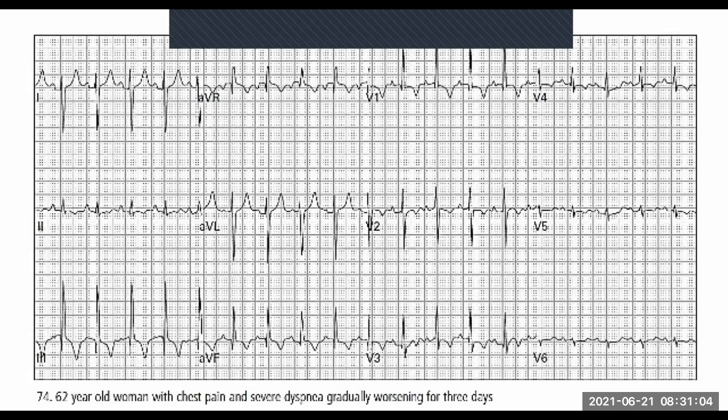You guys should already be getting close to what the diagnosis should be. We've seen this before, right? But anyway, we've got these inverted T waves all along here. So it could still be ischemia, but especially with the right ventricular hypertrophy, chest pain, severe dyspnea, we should be thinking along other lines by now. Let's go to the septum itself.